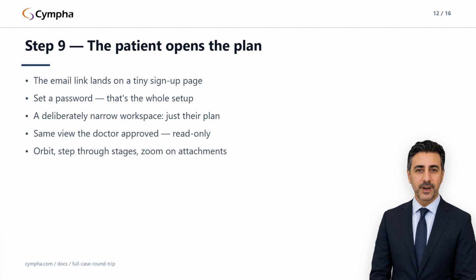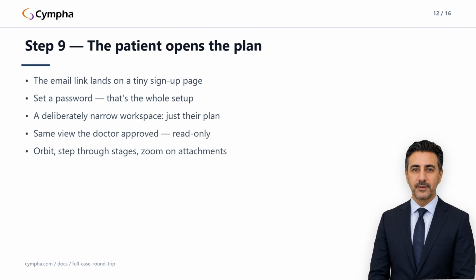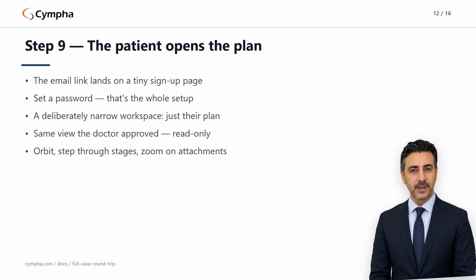The patient cannot see other patients, cannot see the doctor's other cases, cannot see the case folder, and has no editing tools at all. Even the Cympha Studio Chrome is hidden in the patient workspace, only the viewer is shown. Then they click open, and Cympha Studio loads the shared plan, the very same view the doctor approved, read only. And they can genuinely explore it. Orbit the model. Step through the aligner stages one by one and watch the teeth move. Zoom in on the attachments.